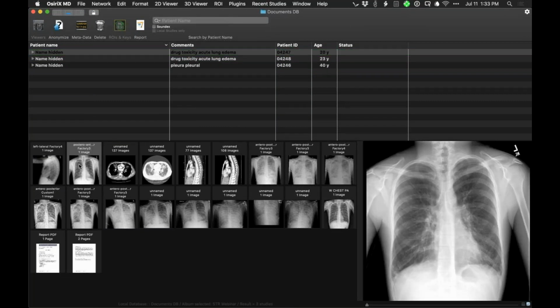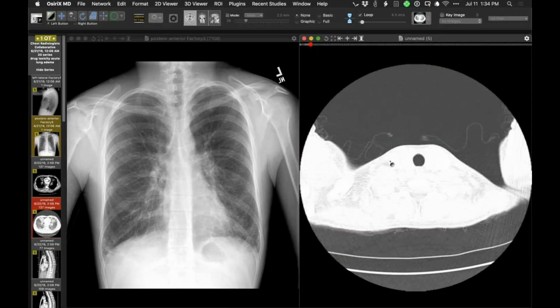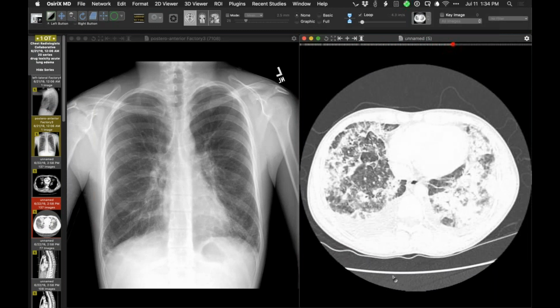So the story is that this person was ill around the 21st of June and went to an Instacare. I'm not sure what was diagnosed, but you'll see in a moment that he got progressively ill rather quickly. So I'll bring up the CT from the next day, when you can see that his lungs look like that, just extensive consolidation.